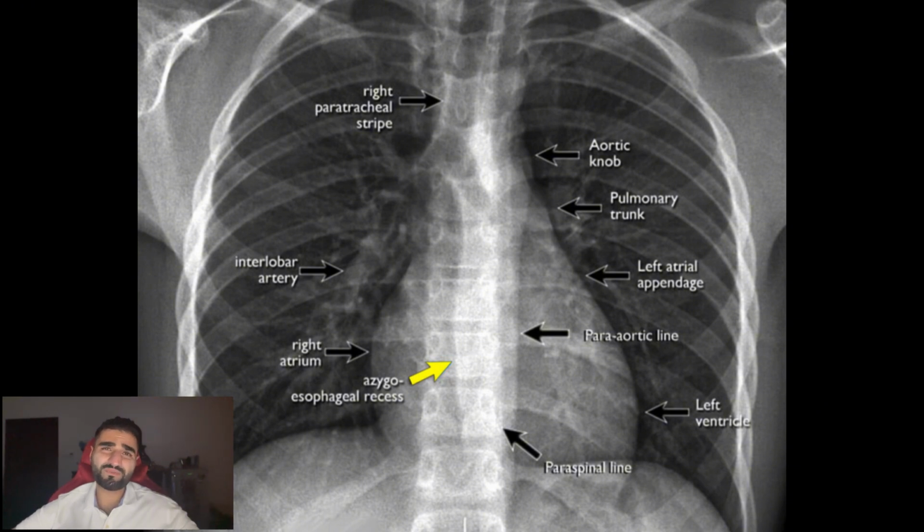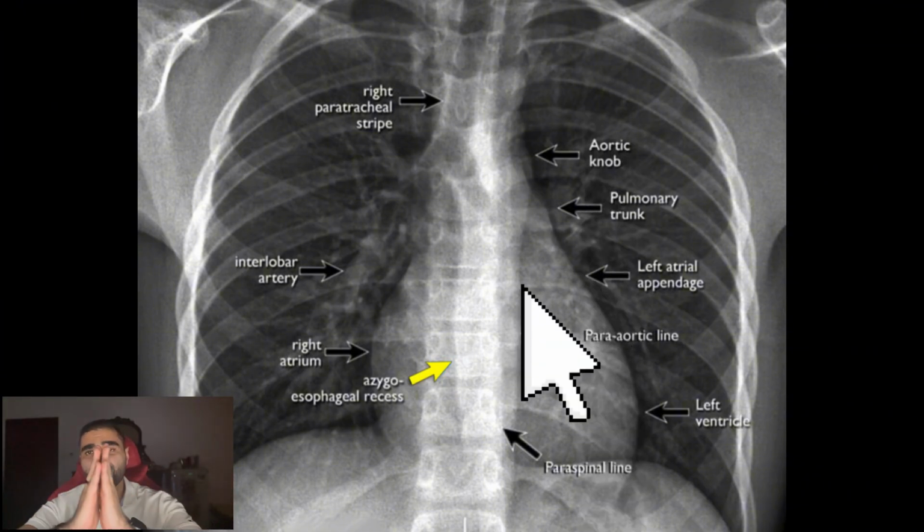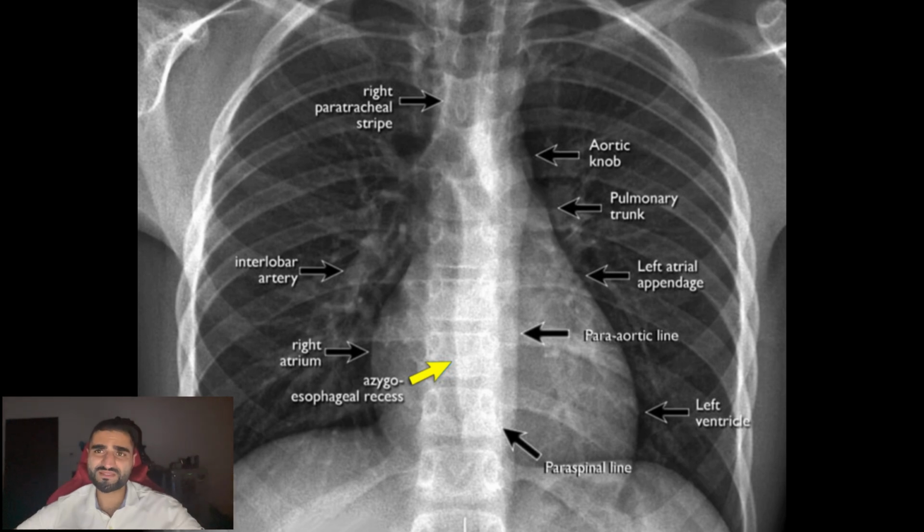However, there is another approach that is very simple. However, I sometimes miss things with this approach. It is from middle to the outside. You come here towards the spine and then you move rightwards down up to here and then to the left side and here. You start to see anything that is abnormal. So you have to examine it from up to down and then from middle to the outside. I hope that is clear as to how to approach a chest x-ray.